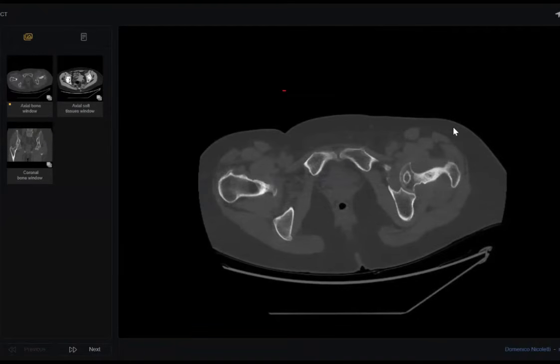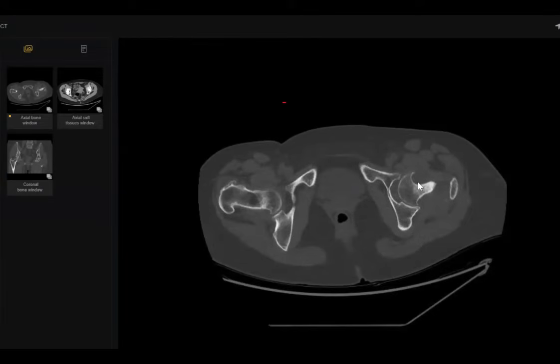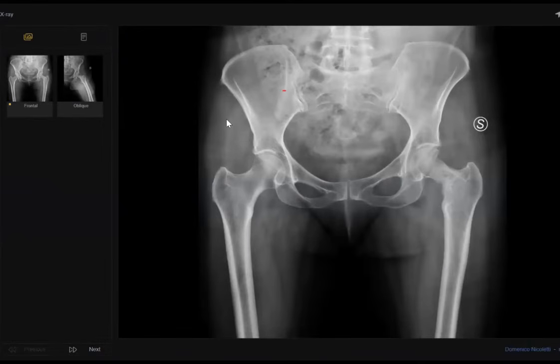No joint effusion. If we consider PVNS, there is no joint effusion noted as well, and there was no blooming artifact seen. What is the name of this sign? This appears to be like an apple core. Apple core appearance on X-ray is very pathognomonic for synovial abnormality, proliferation. Not aggressive or malignant, because this is a chronic process. This is the first most important thing.